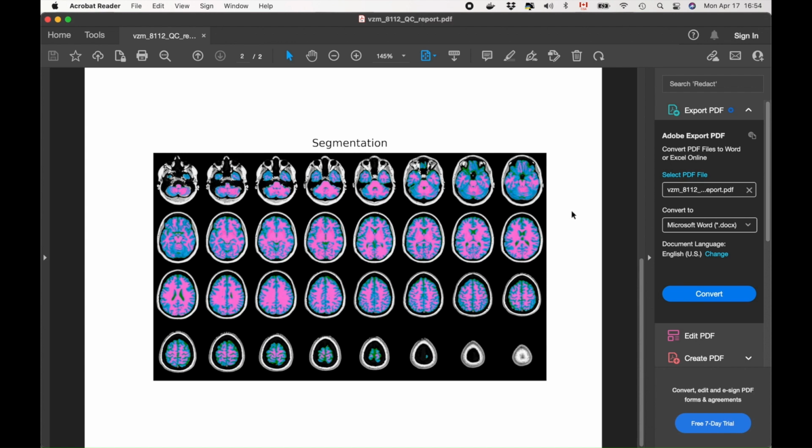Moreover, I want to insist that you have to be aware of the general orientation of the brain. If you see a misorientation, meaning the brain does not seem to be well aligned or the brain is not in the center of the pictures, then something went wrong with the registration. For skull stripping, you have to be attentive to the extent of the red overlay. It has to fit the brain as precisely as possible.